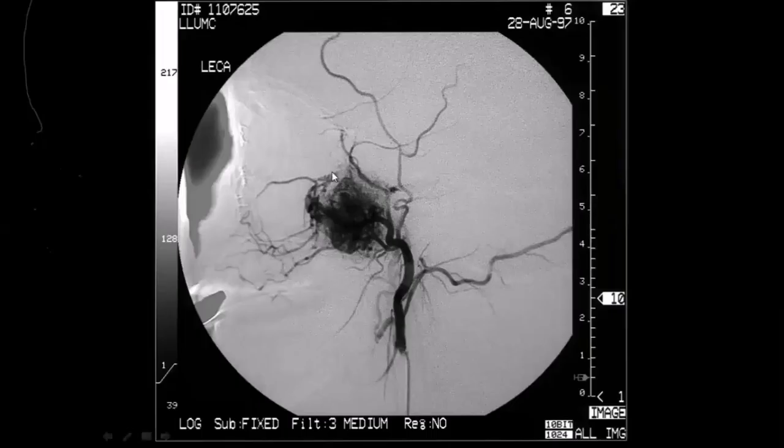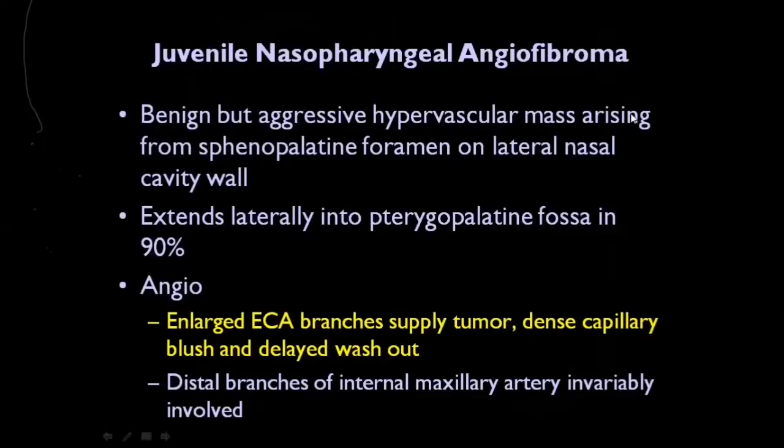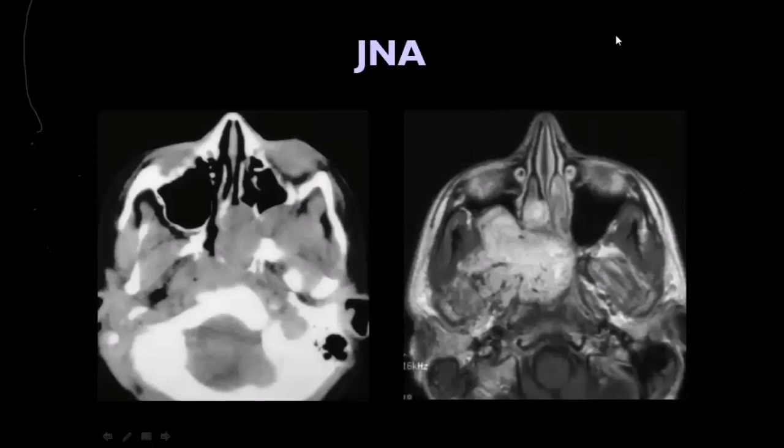So as Dr. Min said, it will be angiofibroma. So don't forget it, because we always rush to nasal polyposis or whatever. So don't rush to that; before that, ask, is it a boy, is it male? So this is a hypervascular lesion centered in the pterygopalatine fossa. And the next step, they will ask you about the next step: do angiography, and we should make some embolization to reduce the size of the tumor.